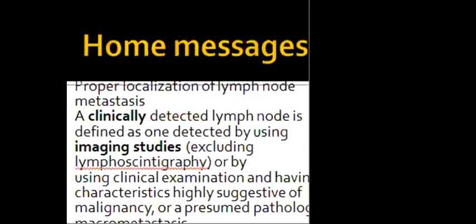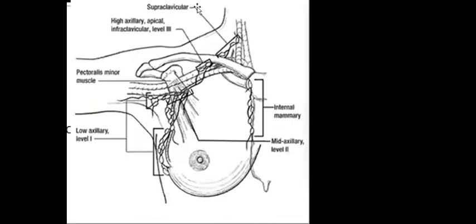So there is a lymph node metastasis in the right supraclavicular region, and also in the right axillary region. Rabab, perfect. So lymph node metastasis or lymphoma, but for these specific sites, sure, the best option you would put in the differential diagnosis would be breast cancer. You know that breast cancer staging includes the supraclavicular and the axillary lymph node metastasis.